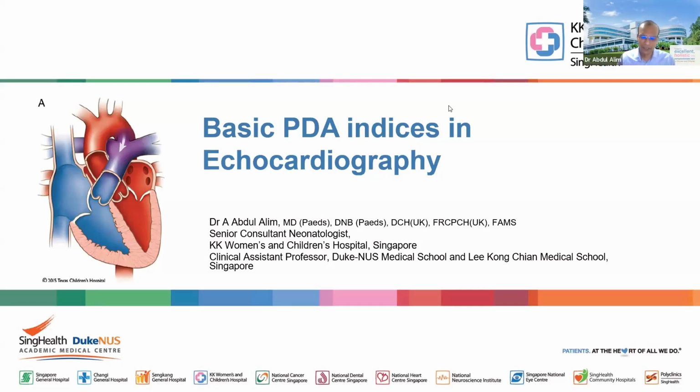PDA, like Dr. Mohit informed, is a very common condition in premature neonates, and almost everyone who works in the neonatal intensive care cannot go without getting into the controversies of diagnosing and managing the PDA. So in the next 1 hour or so, I would like to talk briefly about PDA, and then how we can echocardiographically assess the hemodynamic significance of the PDA.